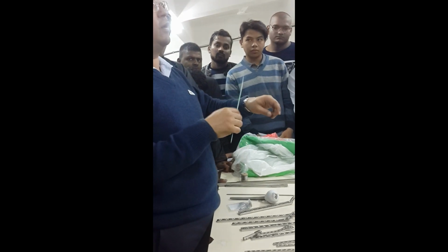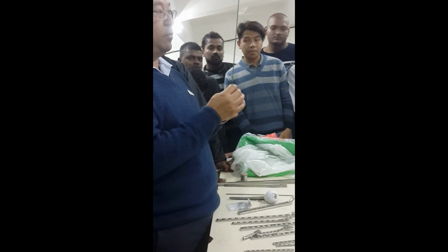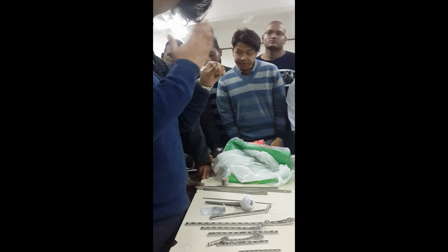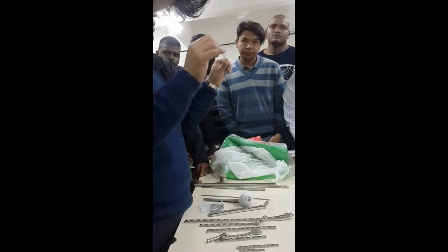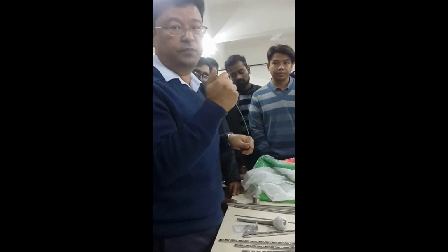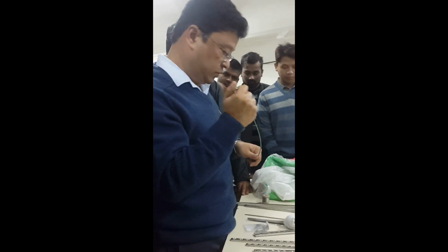In radius and ulna, you just put a single one. But in humerus, femur, tibia, two. So this is the titanium elastic nailing system for long bone fractures, and it's mainly for mid shaft fractures. Mid shaft you can answer the question. Distal fracture ends you cannot apply, because the three bony point fixation will not be followed.